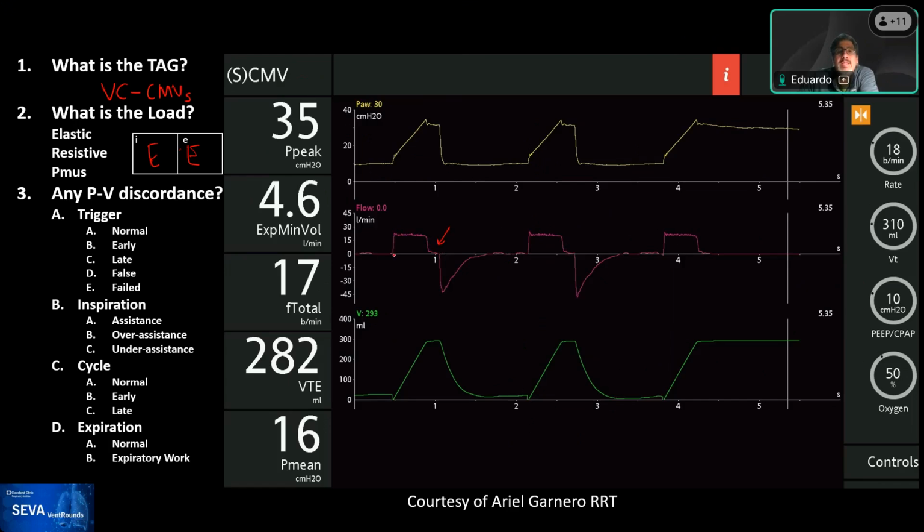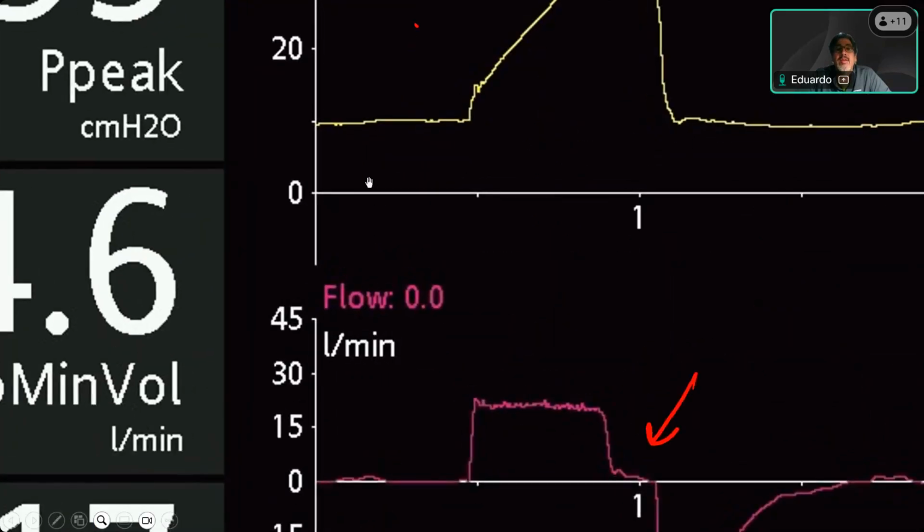But you can see as the flow increases rapidly, there is this step up. And I'm going to amplify it for a second. And you know that every time I amplify this, I make a mistake, but just tolerate it for a second. And so you can see now the step up in pressure with the increasing flow immediately.